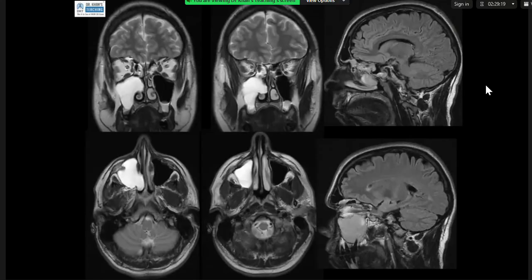the right ethmoid sinus, with evidence of cortical breach. And it looks like the epicenter of the lesion is within the maxillary sinus, and from there it extended into the ethmoid sinus. So one of the differentials here, I'm thinking, could this be due to inverted papilloma? But I would like to see if there is any CT for this patient.